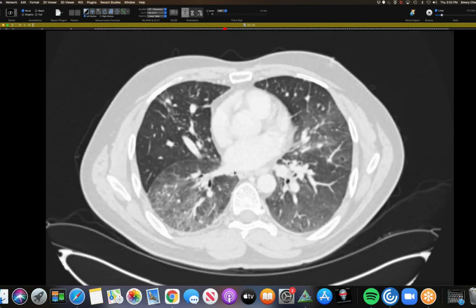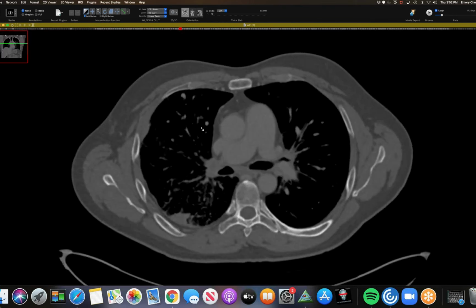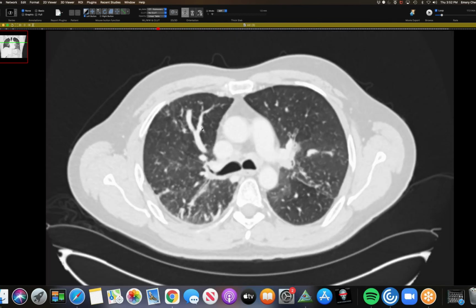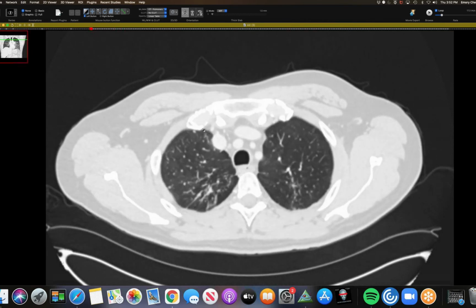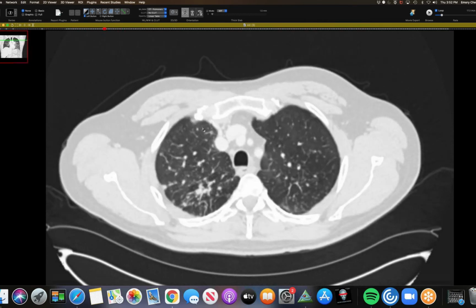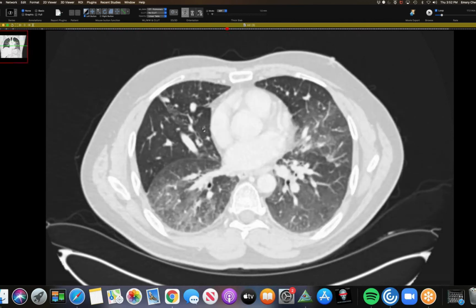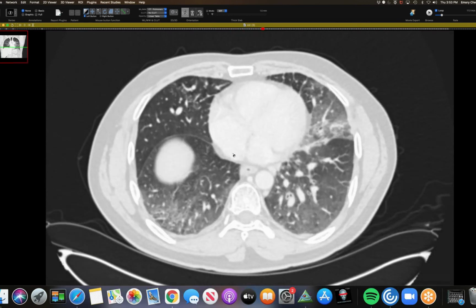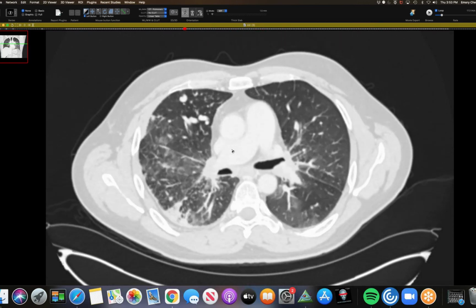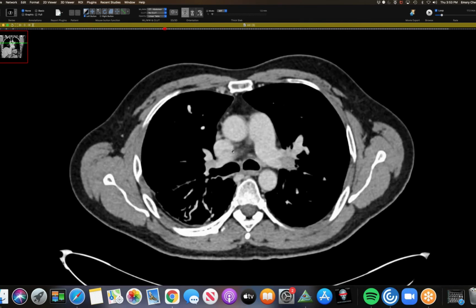Can you show the upper lobes again? I want to see if there are perilymphatic nodules. Go all the way to the top. Let's take a look up there first with the lung windows. There are some nodules there, but yeah, there may be silicosis. I've seen a fair amount. I know David's probably seen the most. I have not seen a fibrosing mediastinitis phenotype at all, and I wonder if this is a separate process.